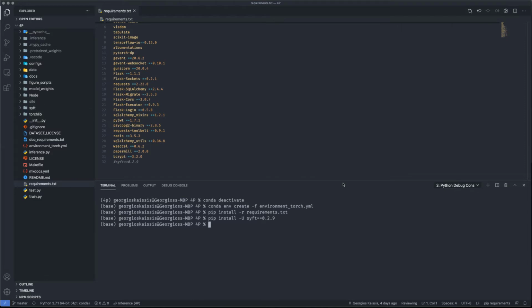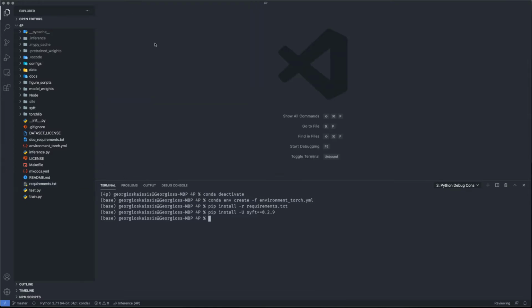So this is still a bit experimental, and as we're moving in OpenMined, we're moving to Syft 0.3, and we found this is the easiest way to actually realize that without driving users completely nuts. So yeah, that's the way to install the requirements.